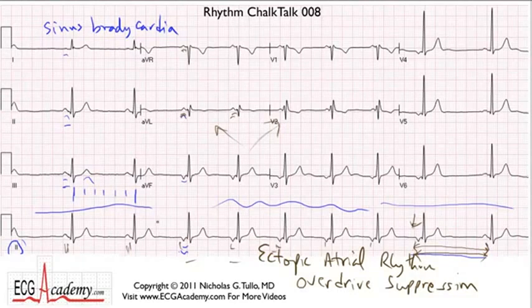All right, so I think the other thing to point out is that in this 12 lead, you do have an RSR prime pattern in V2, a little bit of it in V1, but the QRS complex isn't wide enough to really qualify for a bundle branch block, but this allows you to diagnose an incomplete right bundle branch block.